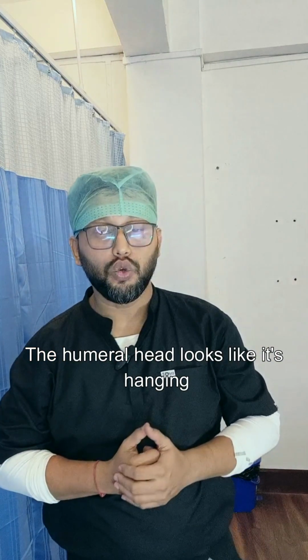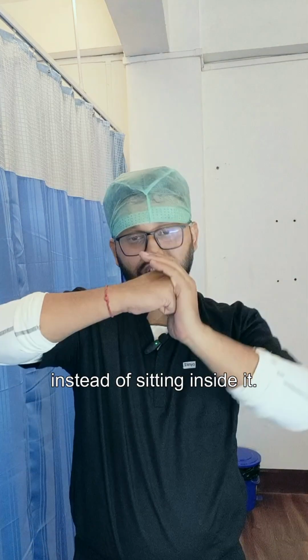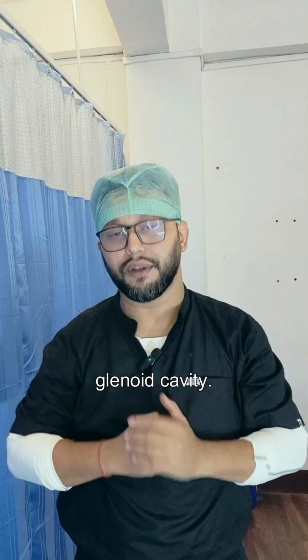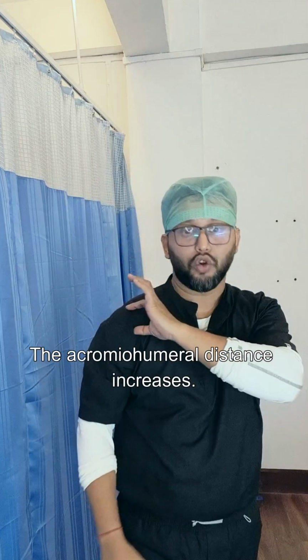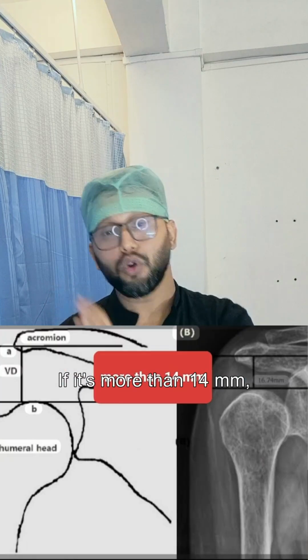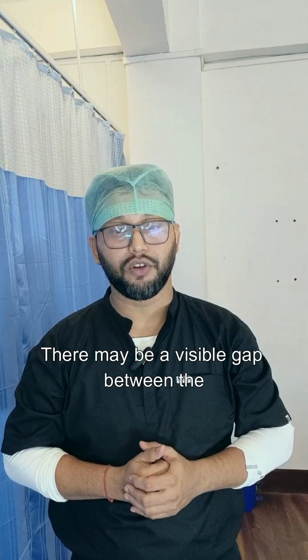The humeral head looks like it's hanging below the socket instead of sitting inside the glenoid cavity. The acromiohumeral distance increases. If it's more than 14 mm, we suspect subluxation. There may be a visible gap between the glenoid cavity and the humeral head.